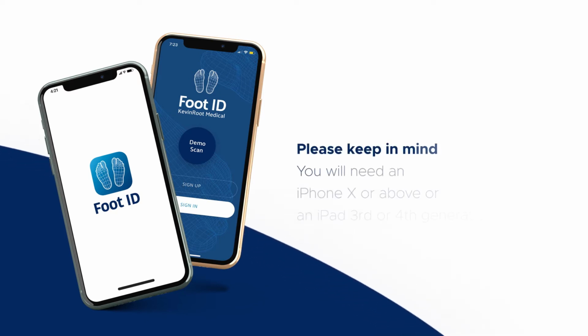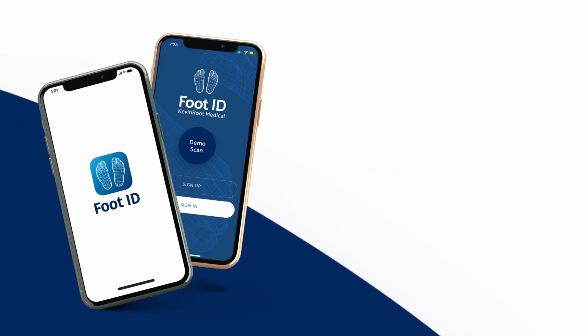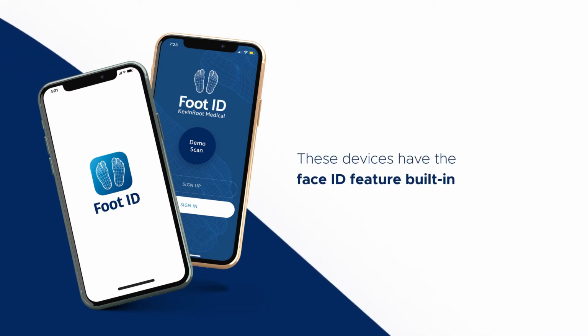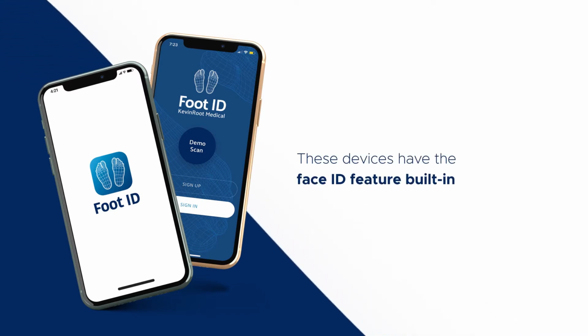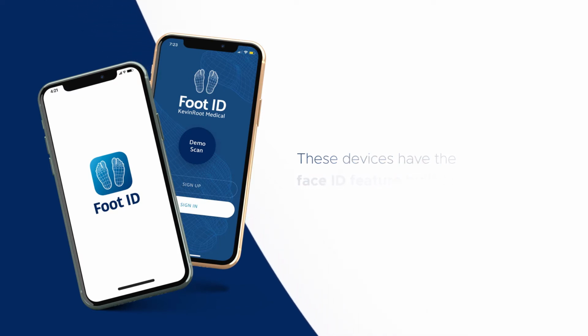Before we continue, please keep in mind you'll need an iPhone 10 or above or an iPad Pro 3rd or 4th generation. These devices have the Face ID feature built in, and you'll need this feature in order to use the Foot ID app moving forward. Now let's begin.